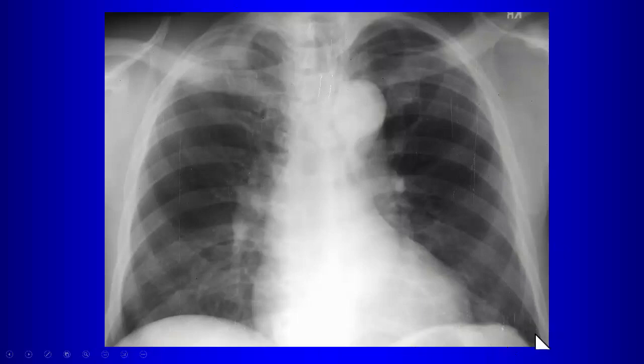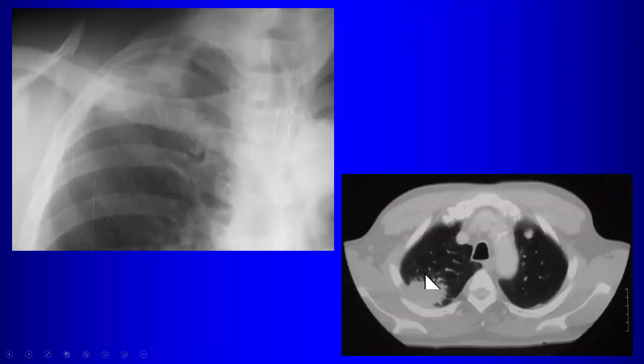Over here, if that happens, it's going to be a pleural effusion. Over here, it might be a pleural mass, right? Up here in the apices, you could have pleural thickening or you could have a mass in the apex. You want the blackness of the lungs to go out to the edge of the ribs. And if it doesn't, you want to look for an explanation of that, okay? So there's an apical tumor there. There's a lung cancer here in the right apex.